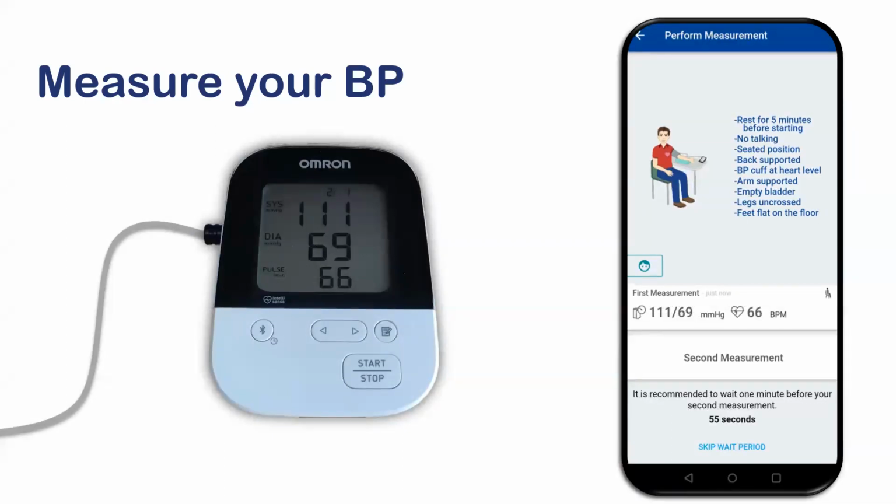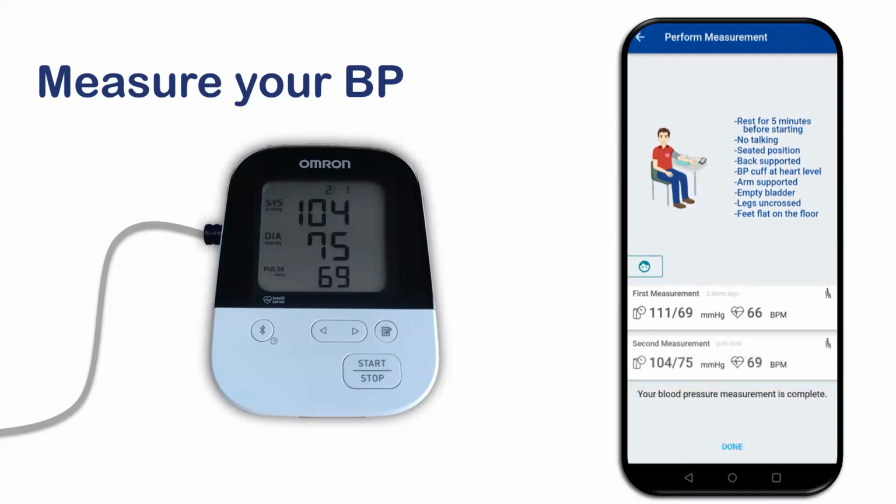We want you to take 2 readings of your blood pressure at one sitting. As soon as you finish your first reading, a countdown will start at the bottom of your screen. Please wait 1 minute and then press the Start Stop button again to take your second blood pressure reading. This second blood pressure will also be sent right to your phone.